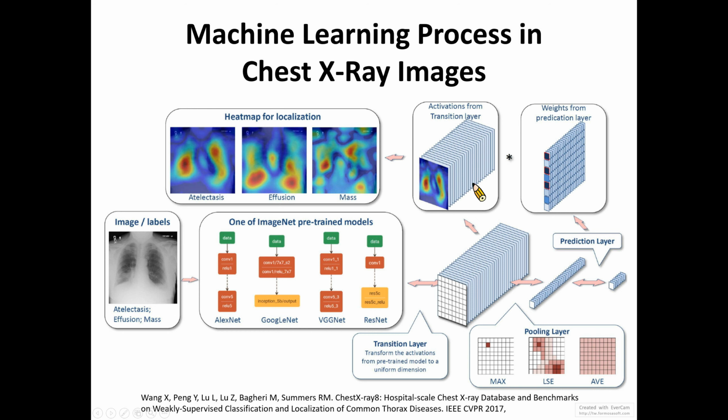It takes a little bit of time to load the website. Okay, so here you can see that it has some explanations. AlexNet has been trained on over 1 million images and can classify images into 1,000 object categories.